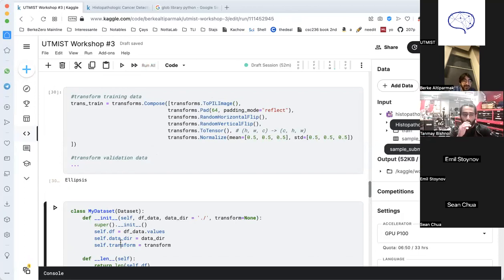So in the chat, let me know if you have any questions about the transformations that we do, because transformations are essential. So we visualized our data, and right now we are processing our data. So I need your 100% focus here, because this is essential for each model that we do, each machine learning project that we do. We need to transform our data.